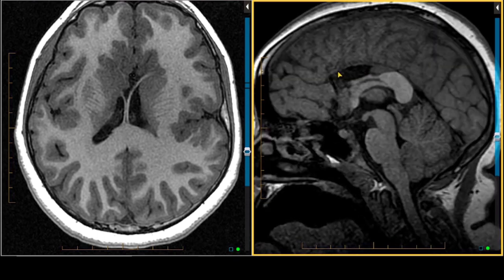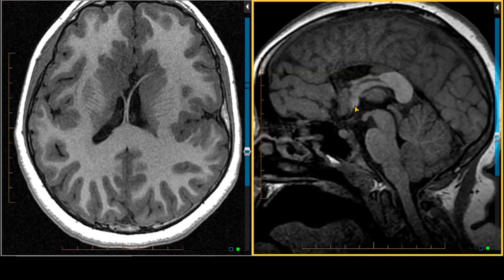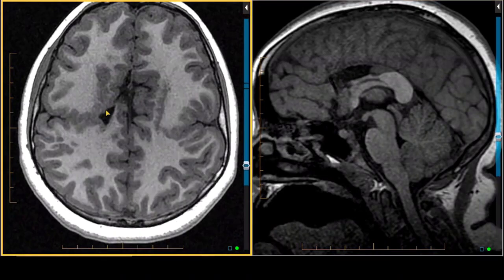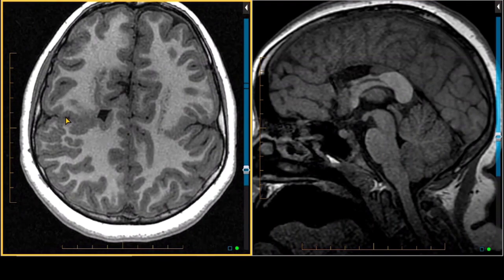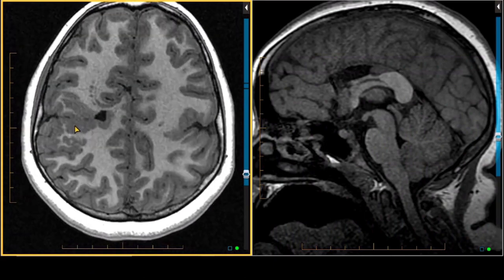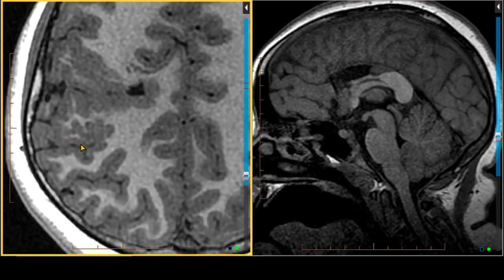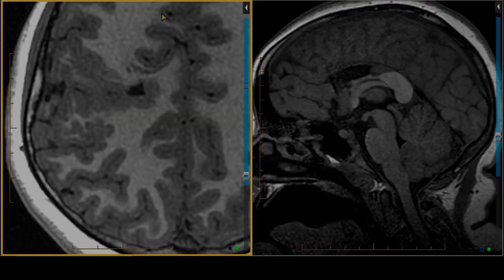We don't see most of the body, the genu, or the rostrum of the corpus callosum. We see a somewhat thickened anterior commissure. As we scroll up, we see a closed-lip schizencephalic cleft going to the lateral margin of the posterior body of the right lateral ventricle, lined by polymicrogyria. You can see here there are areas of polymicrogyria adjacent to this closed-lip schizencephalic cleft.